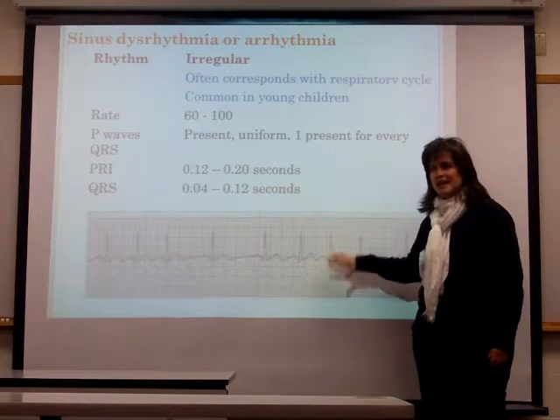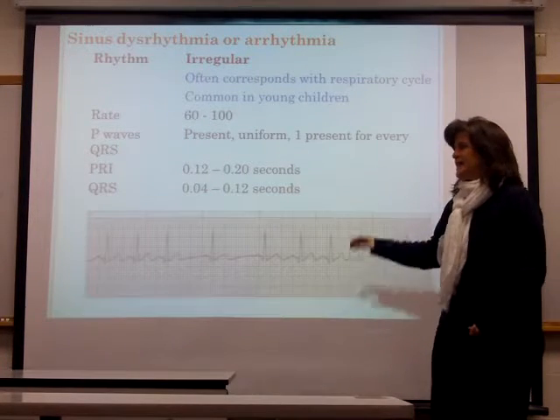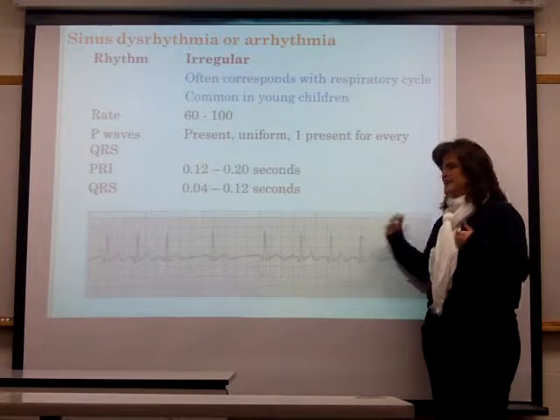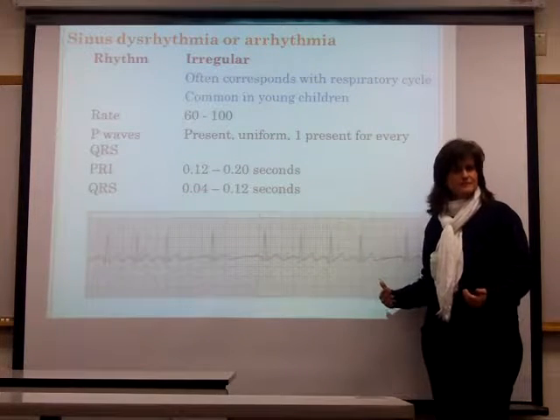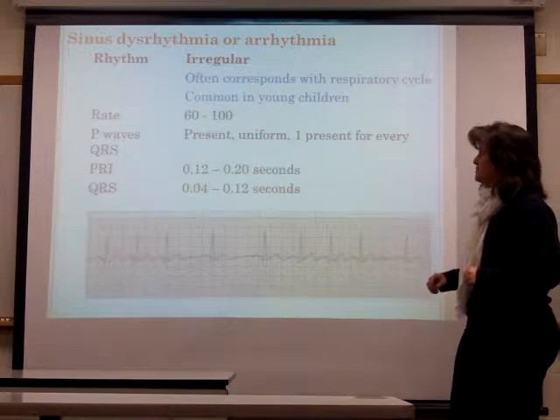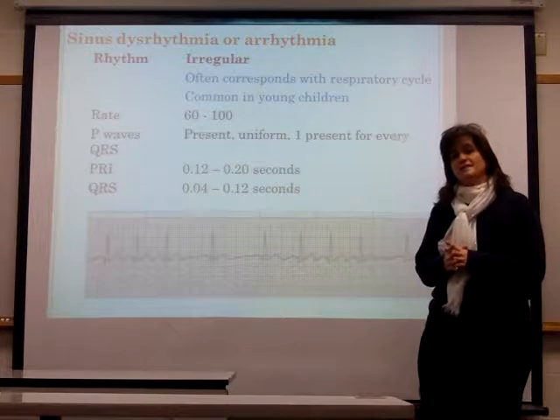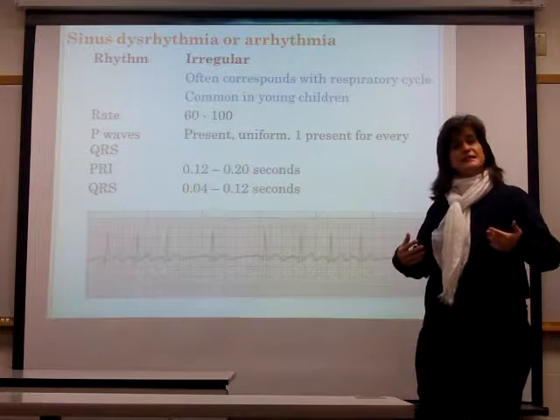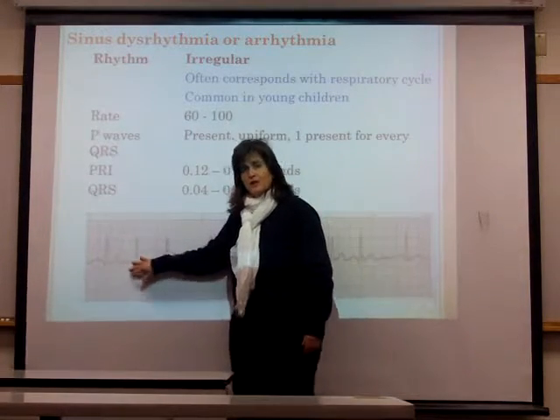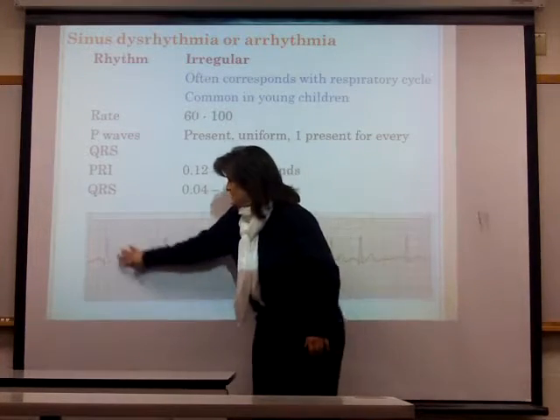So again, in this case, if there's treatment, it's usually driven off the rate, and in most cases, it's going to be a slow rate that leads to treatment. If it's a fast heart rate, we may give something to slow it down. And again, that's a very individualized type of scenario. When you see this dysrhythmia, the most common cause is respiration, so the act of inhaling and exhaling. When you breathe in or inhale, there's more pressure on the heart because the lungs take up more space, which is what we're seeing here.